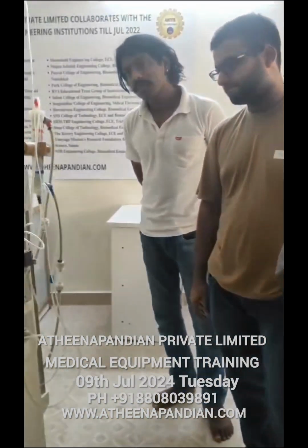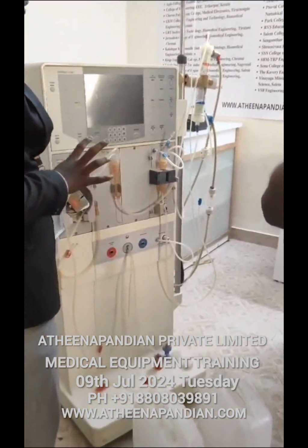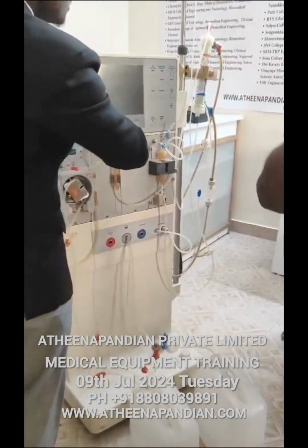Once we need to turn on the machine, firstly we need to check everything. First we need to drain the machine, all those things. Drain the machine after you turn on the machine.